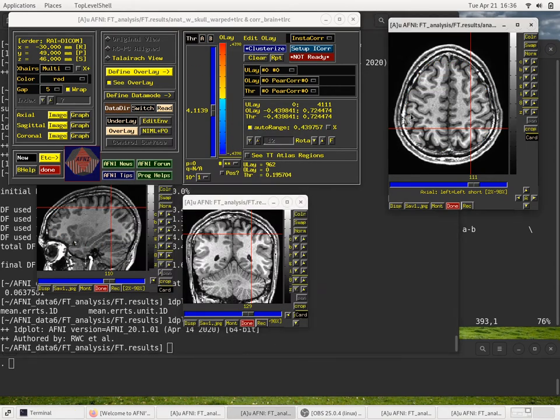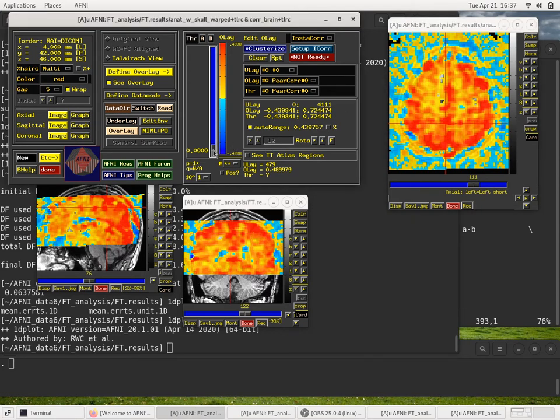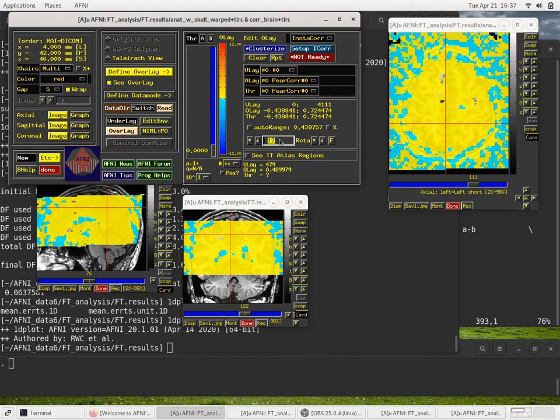And it's beautiful. We see absolutely nothing. Well, we're thresholding at 4.11. Let's just drop this down. And so then the question is, is there anything in here you have to worry about? We'll scale this back up to 1. You see structure left in there, so there's stuff happening in the data that we're not modeling, since this is in the residuals, and it follows the structure a bit. So there could be a question: do you want to do a better job modeling? So breathing artifacts or things like that.